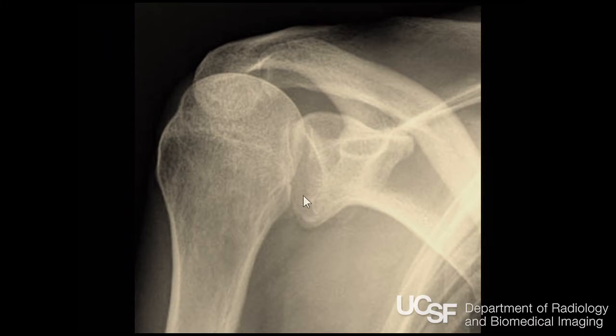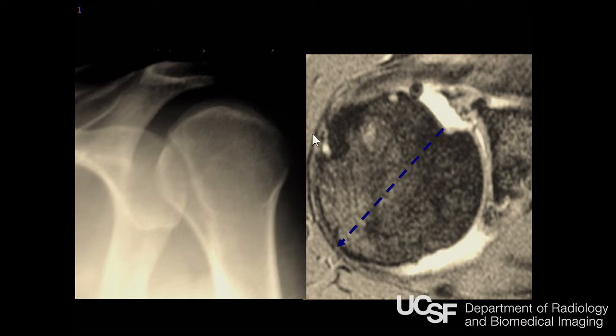Here's another posterior dislocated shoulder, but you can see there's really not a lot of vertical malalignment. It's a little bit up, but not too bad. But it's indented here. And so you can have what's called a reverse Hill-Sachs, sometimes called a trough sign. It's this indentation in the anteromedial cortex of the humerus because it impacted the posterolateral glenoid rim when it dislocated posteriorly. Here's another example of the trough sign. And that's an MR showing it.